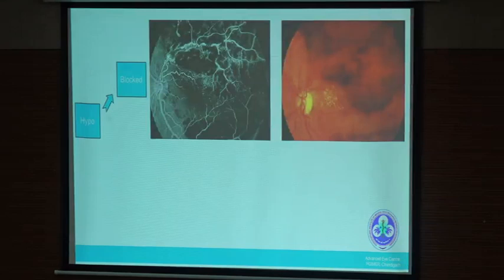Always interpret fluorescein with the clinical picture there. Don't call it a hypo there, because I'll show you. So this is a hypo due to the block. Your block is the blood. That is why you don't get fluorescein angiography in an acute BRVO patient, because you will not know whether the blood is causing a blocked fluorescence, or there is a capillary non-perfusion due to BRVO. That is why you let the hemorrhages resolve in 8 to 12 weeks, and then you get an angiography to get a true picture.